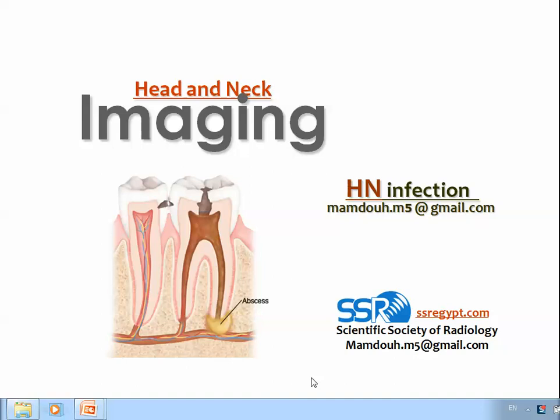Dear colleagues, now we are talking about one of the head and neck topics which will deal with the imaging of head and neck infection. And, as you can appreciate from this figure, one of the leading causes of head and neck infection is the lesions related to tooth infection and the formation of periapical abscesses which can spread to the mouth floor and the tongue. This is one of the major issues, especially in the adult population.